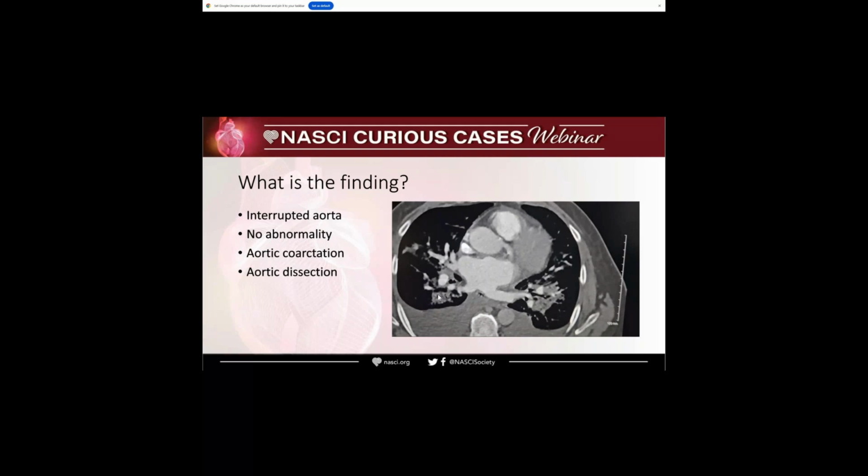Lateral vessels. So basically, because we have a narrowing of the aorta, depending on how severe the stenosis is, we can have other findings that are collaterals. When we have an obstruction, it doesn't matter if it is arterial or venous, the blood usually tries to find alternative ways to get to its destination.